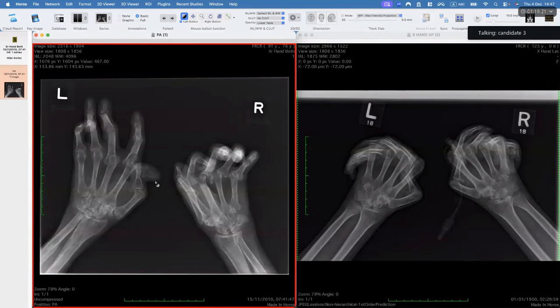It looks like the same diagnosis, but this one also has distal interphalangeal joint affection. This may be erosive arthritis, or rheumatoid arthritis also, because the proximal joints are also severely affected.